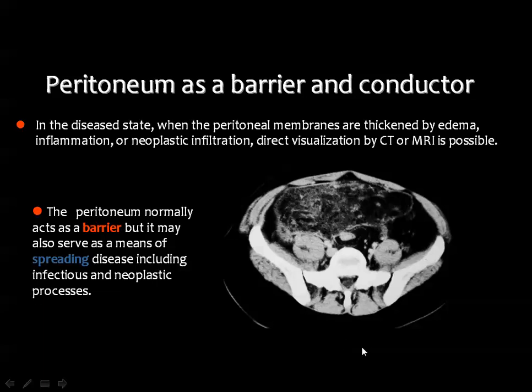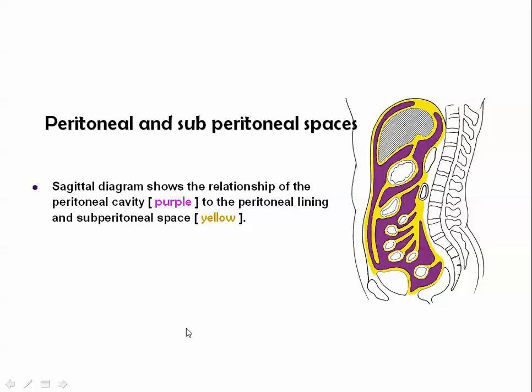And you can see in this example there is some abnormality here in the peritoneal fat. If you compare this fat, which is relatively clear, to this fat which is referred to as smudged or stranded or dirty fat appearance, there are a lot of lesions that can produce such an appearance in the peritoneal and the mesenteric fat planes.